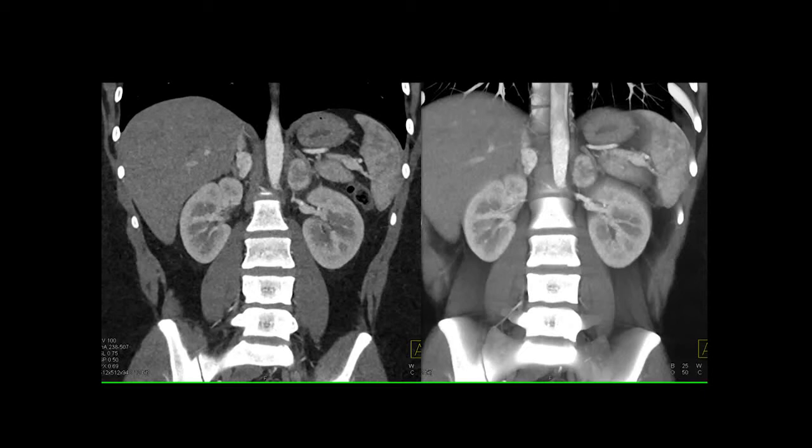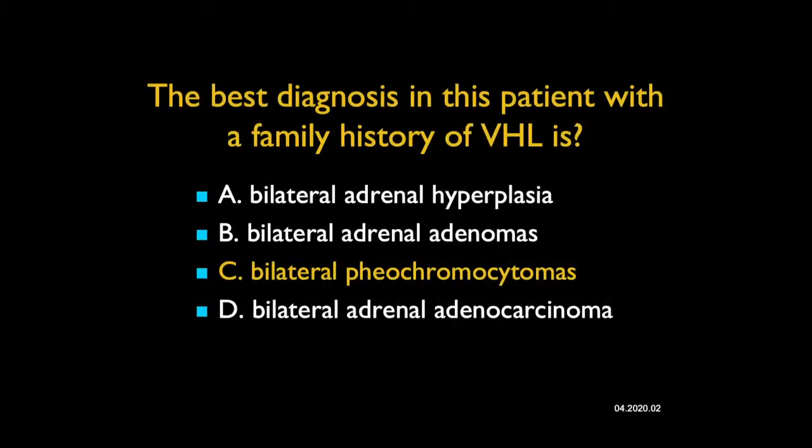They're vascular. Bilateral adrenal carcinomas occur in about 1% of cases, but then usually the primary one is going to be very large and one may be a bit smaller. These are relatively the same size and relatively small. And von Hippel-Lindau patients have an increased incidence of pheochromocytomas and an increased incidence of bilateral pheochromocytomas, and that's what it was. Remember, if you can't remember, Pheo's the rule of 10. 10% are syndromic, 10% are bilateral, and 10% are malignant. These are bilateral adrenal pheochromocytomas.